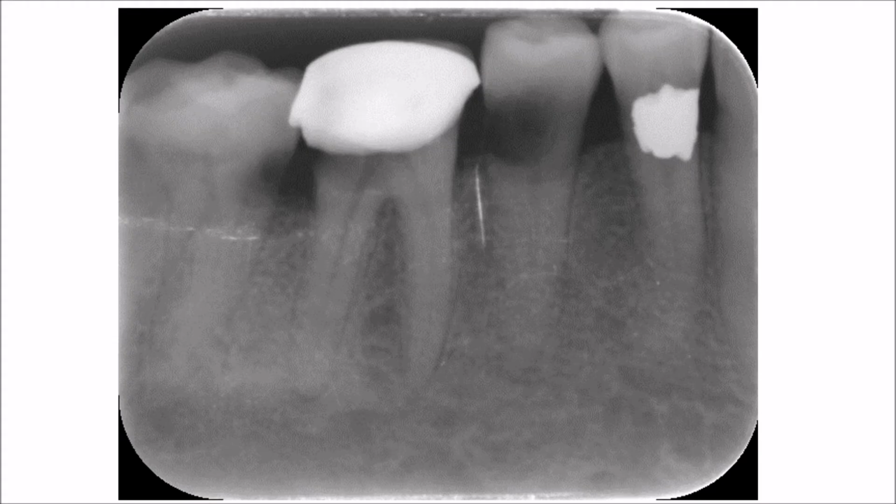This periapical radiogram of the premolars and the molars shows us different types of carious lesions and fillings. You will see that there is an amalgam filling on the root of the first premolar, which might have been affected by root caries or a treatment for root caries. The filling seems to be fine. There is no radiolucency around the filling, which might indicate recurrent caries.